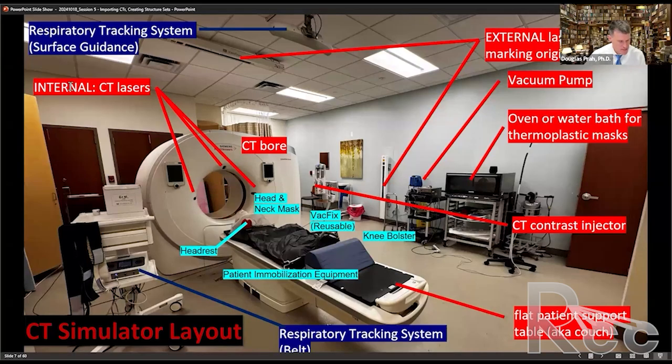You can see on here, there are internal lasers that project and they're integrated into the CT scanner. There are also external lasers. You can see these. In our system, we have them positioned about 50 centimeters or about half a meter outside of the CT bore. And we use these to mark the patient, to align the patient, to set ISO or any other references. Ours are motorized, but in principle, you could probably also get away with a fixed system, especially if you're not defining isocenter at the time of sim.